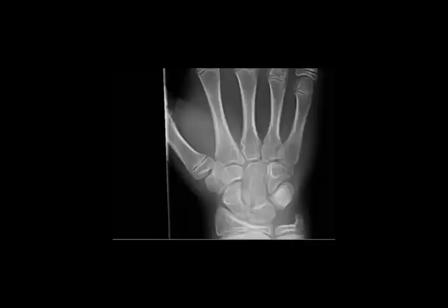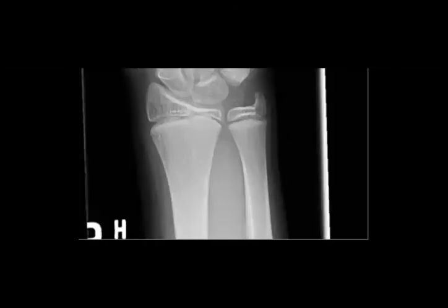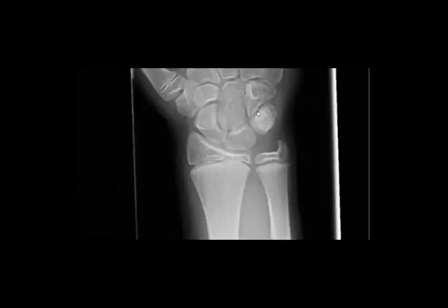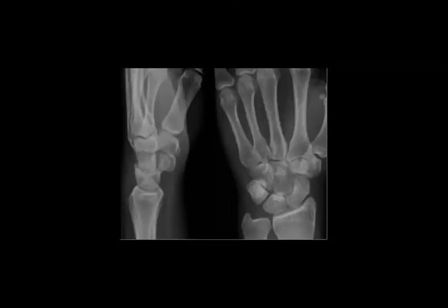Is it easy now when I focus here? Look at this carefully. Can you see it? Or should I zoom? Can you see it now? Yes. Okay. So take care with this, it is one of the commonest when you look at the wrist. Check it. Now you will check for everything.